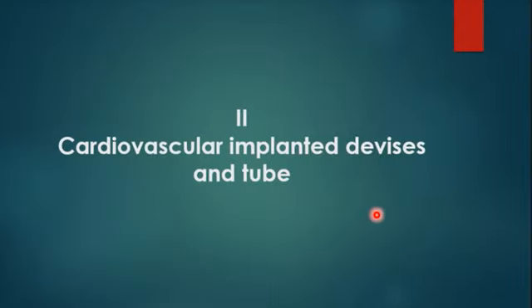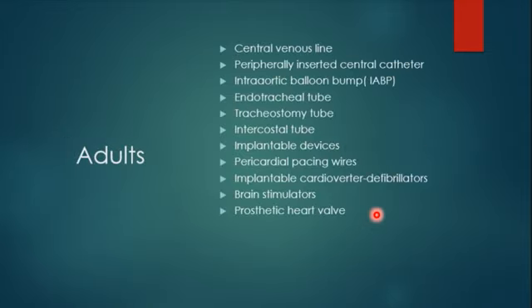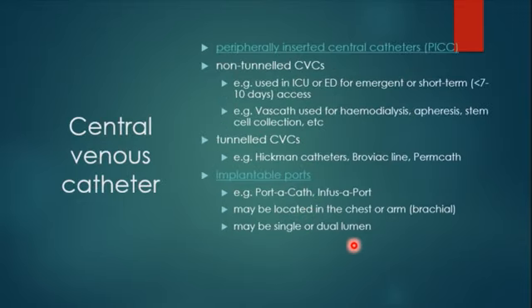Now jumping to a very important subject, cardiovascular implants. I hope to cover half of it if I have time. We will also talk about the central venous lines slightly, and then the intra-aortic balloon pump, the endotracheal tube, tracheostomy, and implanted devices, some pacing wires, some pacemakers, and prosthetic valves.